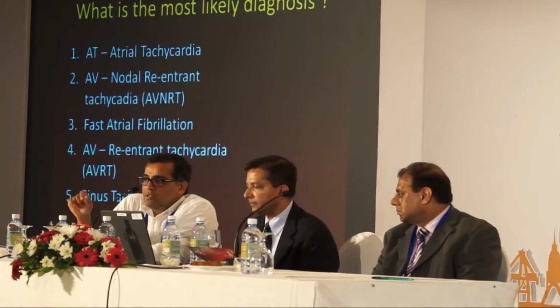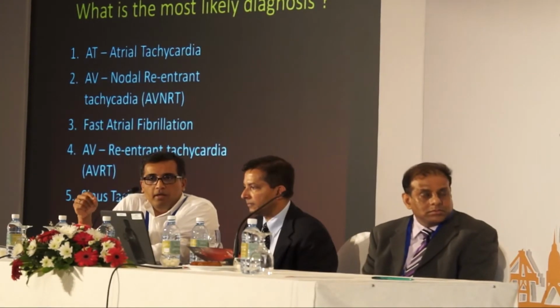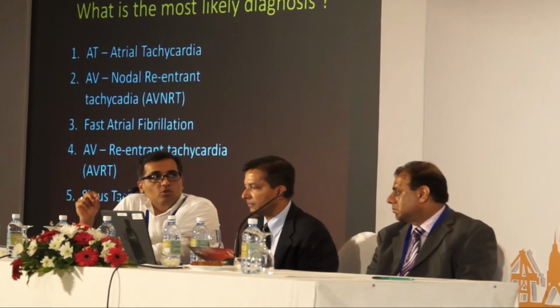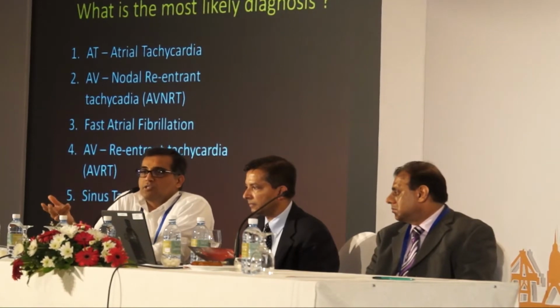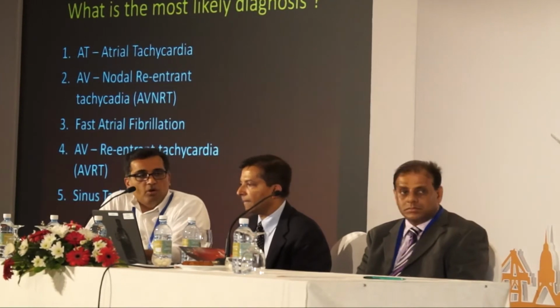And it's a common mistake to imagine that this could be sinus tachycardia, but even with a rate of about 200 beats per minute, you would almost always see a P wave in case of sinus tachycardia, if it is either inappropriate sinus tachycardia or exercise-induced. EKG manifestation that you come across.